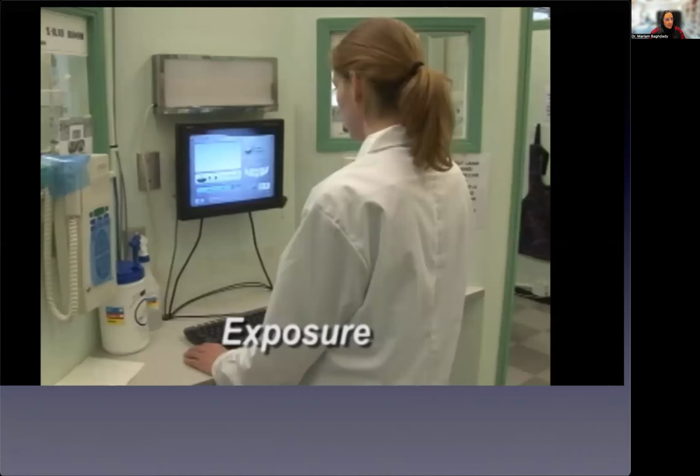Exposure, as we said before, we can make errors in exposure time, either not clicking all the way to the end, or if the patient is too hunched forward. So during the exposure, it hits the patient's side. So we get one side only because the machine will stop automatically for safety reasons if it hits the patient's body, and you'll get half a panoramic radiograph only.